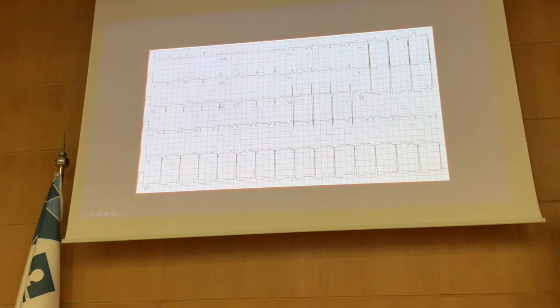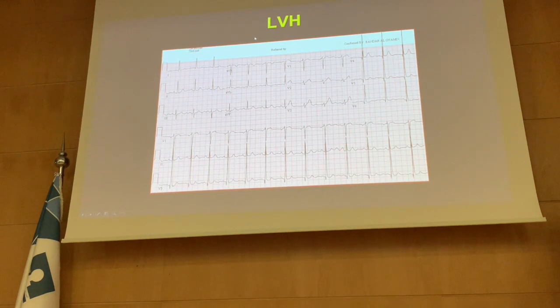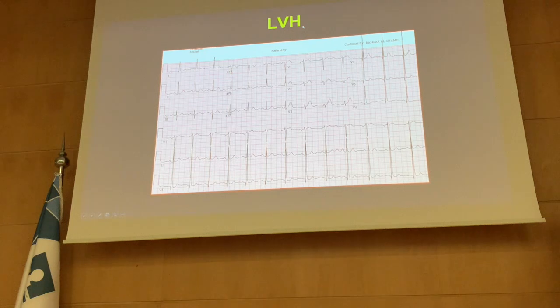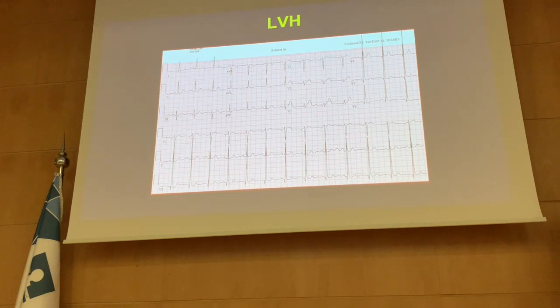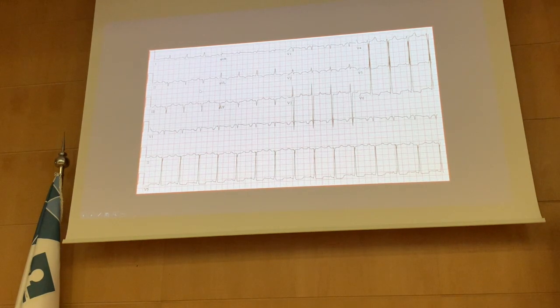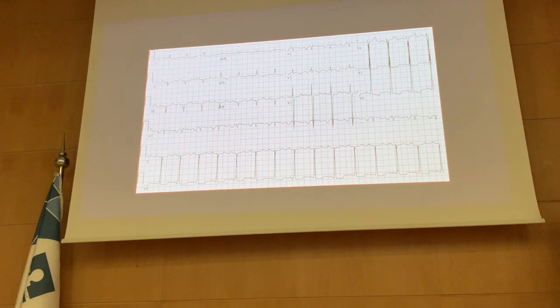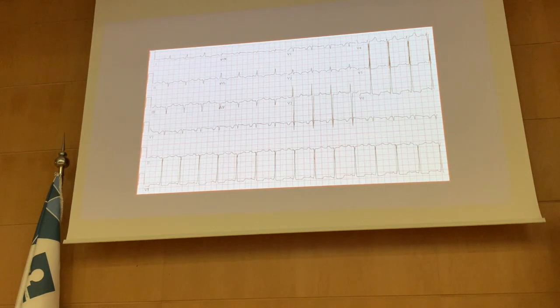Remember, you need to be guided by the scenario. The scenario is what determines it for you. Of course, in the exam we will not give you two complicated choices. We will not give you left ventricular hypertrophy plus left atrial dilatation, that is too deep, too much. So this patient, you need to answer this correctly because this is an exam ECG, honestly.